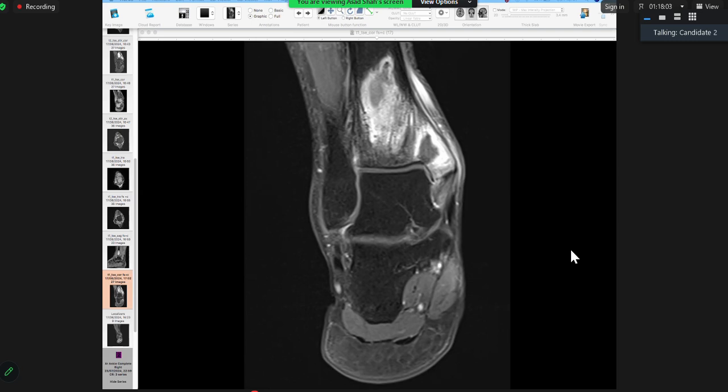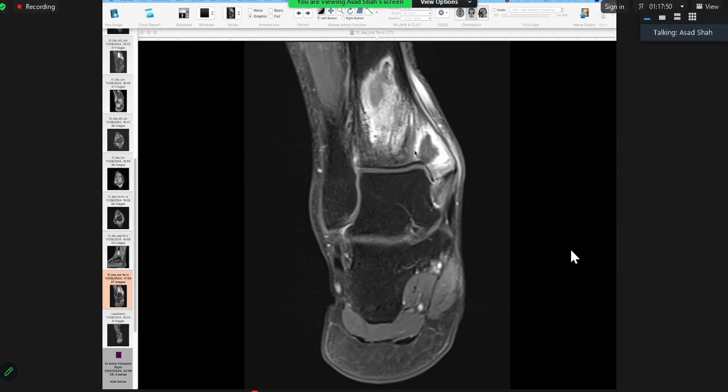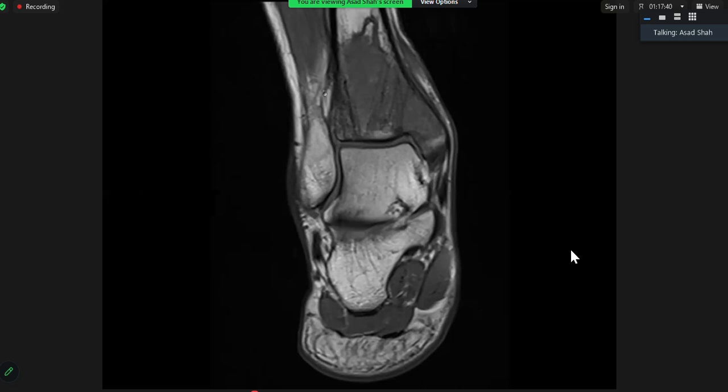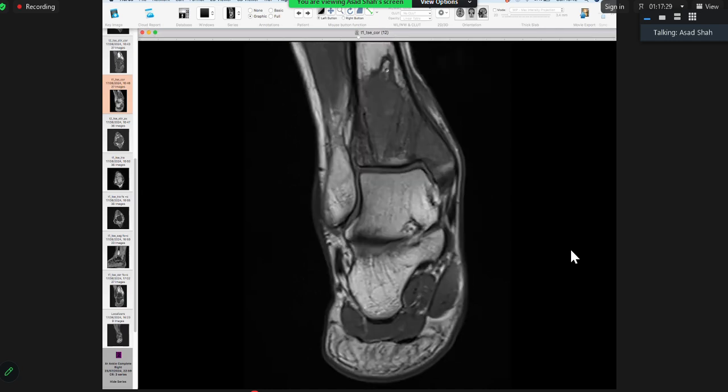Usually Ewing sarcoma, I think it is in the diaphyseal region, I think. Well, it can happen anywhere. I mean, tumors don't kind of follow rules. It's an aggressive kind of lesion with soft tissue, some necrotic foci as well. If you look at the T1, I was with you. I thought this is osteomyelitis as well because you got some fat there at the top, right? And on the post-contrast, there were areas of necrosis, probably liquefaction and all that. But it could be that the patient had a previous infarct or something. And then the tumor just went over it.